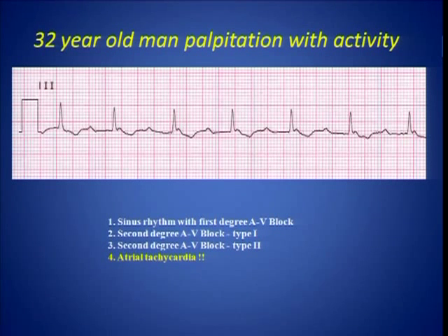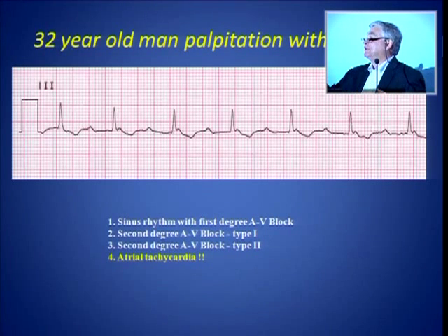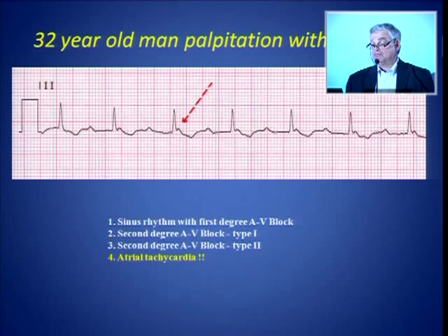And when he gets active, he goes 1-to-1 and he gets palpitation. When he's lying in bed in the emergency room, they want to kick him out because he's 2 to 1. Okay? This can no longer hide from you because that's the answer right there. And this is what causes you to ask the question. When you see a P wave halfway in between two QRSs, ask, is there another P wave there? You may have to give adenosine, you may have to do carotid sinus massage, or you may just have to look a bit closer at the ECG. The wonder of PowerPoint, the ability to blow things up, makes things much easier to see.